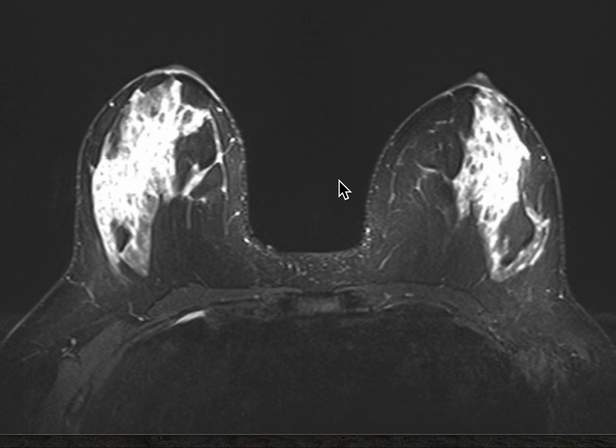If she has some big cysts, I might say bilateral cysts, the largest on the right in the upper outer quadrant, measuring 4.9 centimeters, and then I put the series and image number. I try to keep my reports pretty simple, because you don't want to confuse the referring provider with a lot of words, especially if something's benign. There's no point in talking about all this benign stuff. Though there is a point, for example, if there's a cyst that needs to be aspirated. But I try to keep my reports simple and direct.